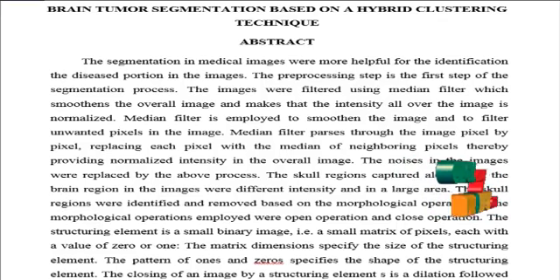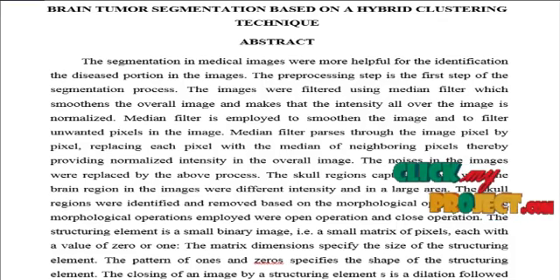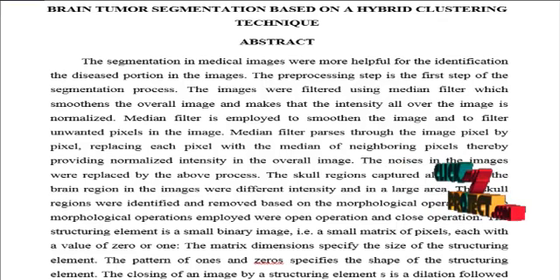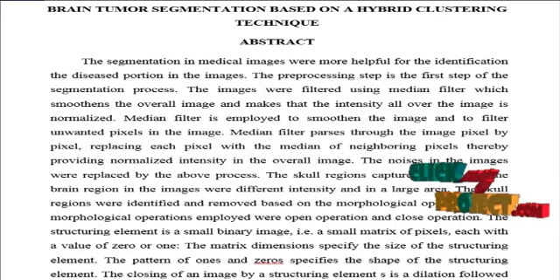Level set segmentation process is employed for the segmentation of the tumorous portions in the input images. Level set segmentation is employed by reducing the segmented portion till the curve closing the regions of interest is obtained. The tumor portion obtained using the thresholding process is considered as the initial portion for the level set segmentation process. The image pixels surrounding the tumor pixels that have similar values nearby are grouped. Contours are extracted around the detected regions. The process is repeated till the boundary of the detected region is within the input region. The final result obtained is a segmented tumor portion.